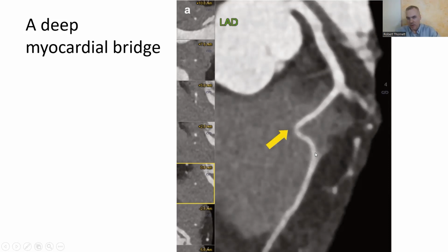So it's not only a myocardial bridge, but it's got that kink in it at that corner, and that's causing problems too. So it's real deep, it's got the kink, and it's pretty long too, because you can see it goes in. There's no black stuff between it and the heart at all, and then it doesn't come up for air, so to speak. It doesn't come out of the water. It doesn't come out of the heart until way down here at the bottom where the black stuff goes back. So it's a long bridge, but this section of it right here is particularly nasty.